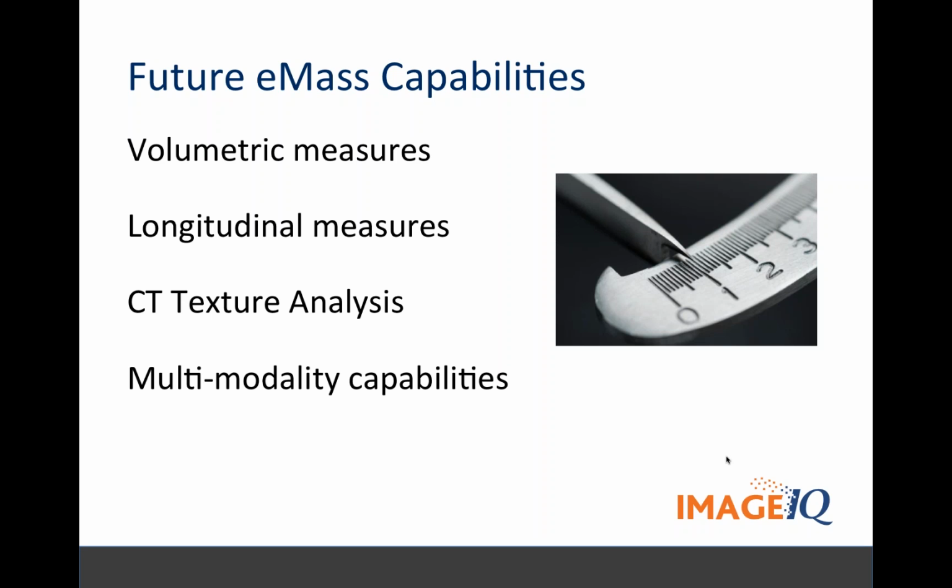We feel like that reduces the amount of variability, so that you're not having these line measurements be off by sometimes millimeters because the pixel resolution isn't that great within some of these slice planes. But as he was doing that, it automatically calculated some of the other biomarkers like the vascular tumor burden.